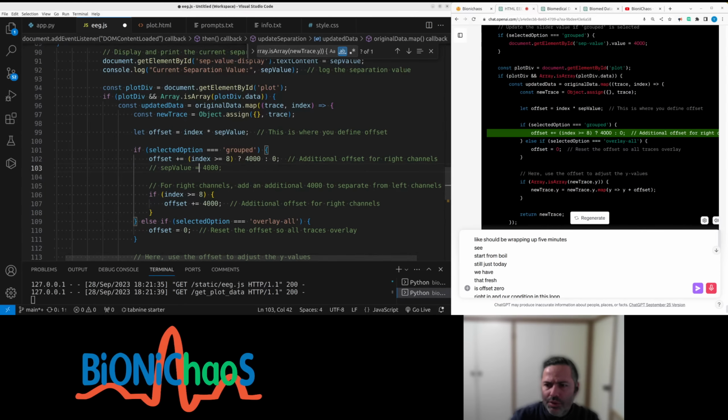Yeah, let's see. So if grouped, doing offset of 4000. We don't need that.